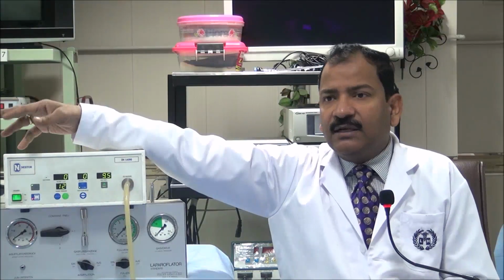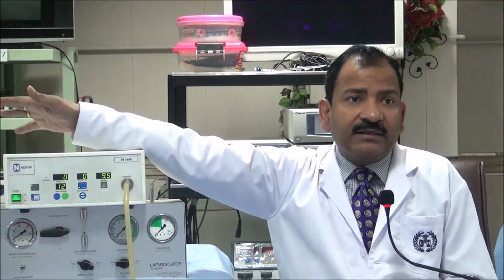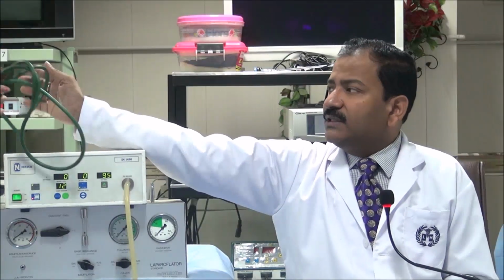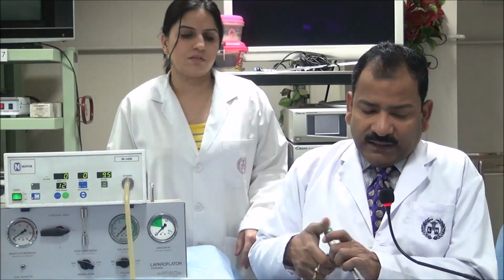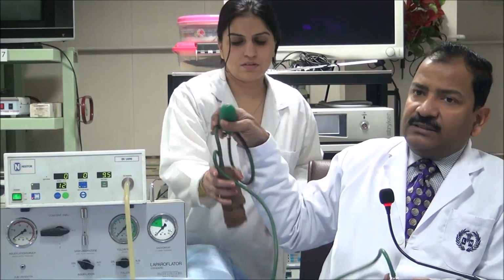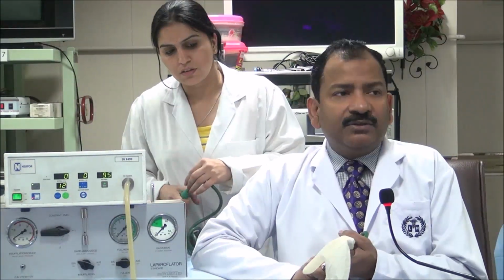It is very easy. Another question is, what to do if accidentally in the middle of the surgery my insufflator becomes empty? Yes, the gas is empty. Then what to do? In those situations, you can use a BP cuff. This is a BP cuff. Clean the tip of this tubing with betadine and then attach it to the cannula. Suppose this is inside the abdomen of the patient, you ask your assistant to pump the air. And with this air also, you can continue your surgery.